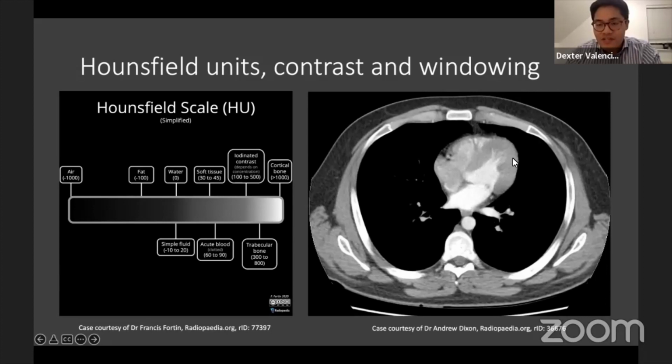In this case, we've given this patient some intravenous contrast, so they've got a cannula. We've given them some dye, which is usually iodine-based, that runs through the body, fills up the vessels, and goes into the tissues and enhances them. As you can see, it's filled up the structures we mentioned before, the left atrium and the left ventricle, a little bit within the right chambers, the right atrium and right ventricle, and it's gone down the descending aorta.